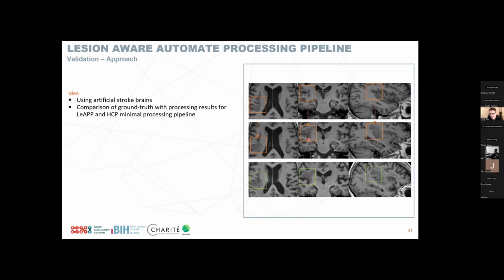We see here this lesion embedded in our healthy control, and visually, in the simplified version that we have now, it's not directly identifiable as being artificial. It is very close to an actual representation of these lesions, while still providing us with ground truth, because we have the actual ground truth of the healthy control.